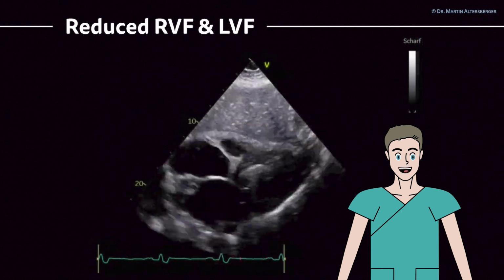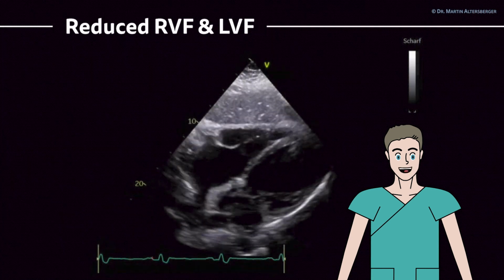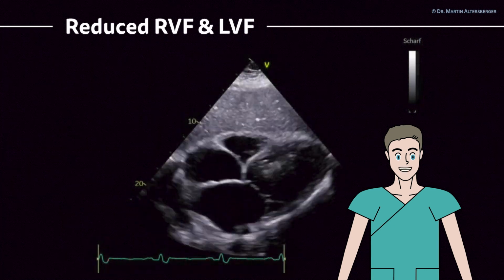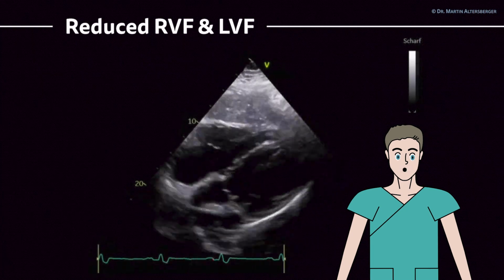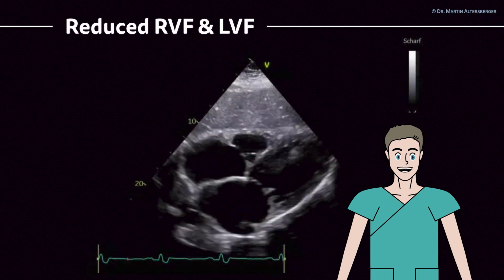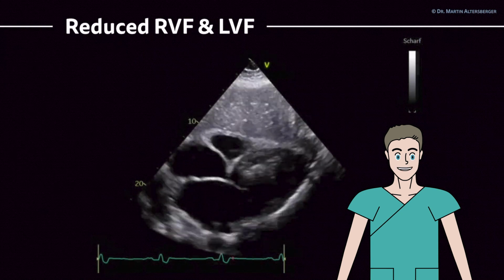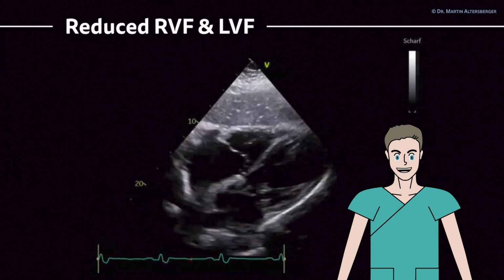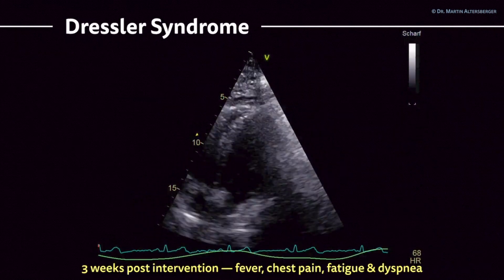And you do see that the left ventricle at least appears dilated and definitely shows a reduced function. You also see this bouncing motion of the septum, which also points towards elevated right ventricular filling pressures. So overall, only with this one view, you can get a lot of information about this patient who actually is not feeling that well and was decompensated.